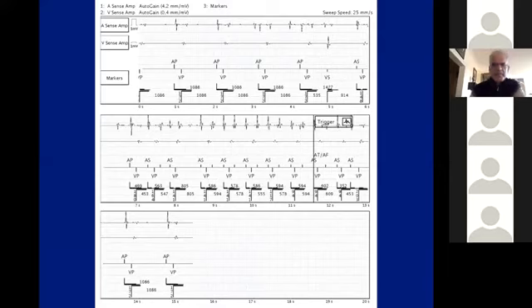Let's see. Here is something that frequently happens during atrial fibrillation. You can see that the electrograms are pretty crisp here, and the device is recognizing pretty much all of them. But what is happening at the top? Did the arrhythmia start here and finish here, or was AFib going all along and then continued here?